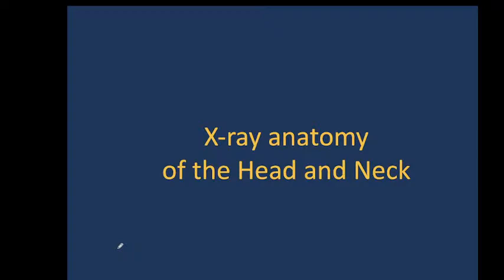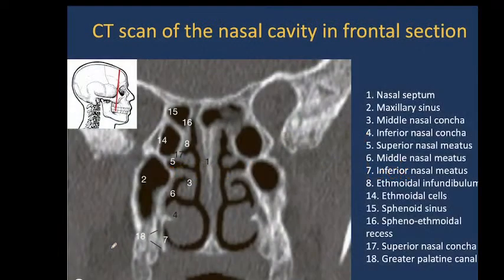Now, we follow to the X-ray examination, and the next part of our lecture is X-ray anatomy of the head and neck.